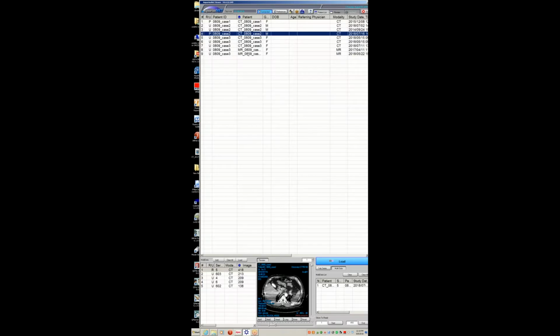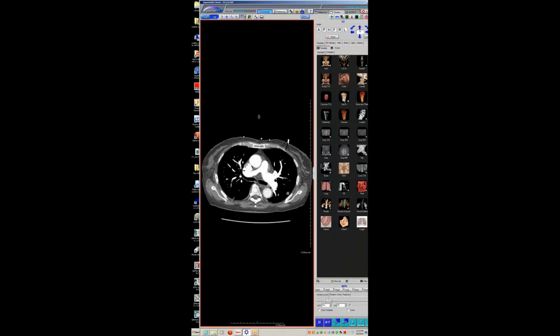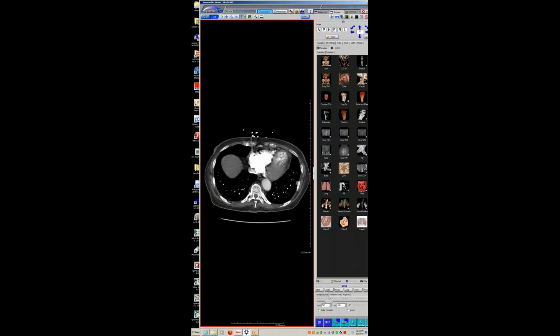And this is a really cool case. You might have to kind of stick with me on this one a little bit. So this was a patient who came in because of abnormal chest X-ray and had these multiple pulmonary nodules, which were called, and something that was missed, which I can understand, was this abnormal thickening of the heart. It looks like normal myocardium. It doesn't look too abnormal here.